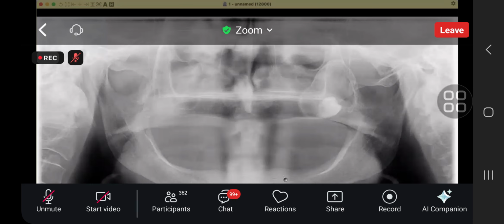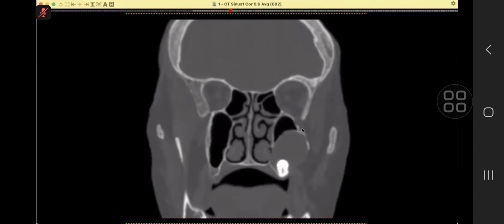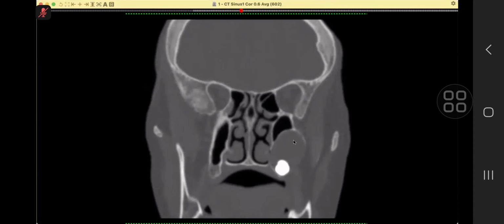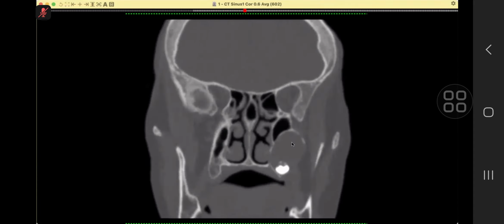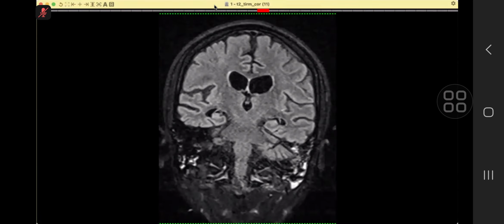So this is it. If you see the whole of it, there is not a single alive tooth, but this is sitting very well and must have been sitting there since ever. And it is projecting into the maxillary sinus and encroaching on it. Okay.